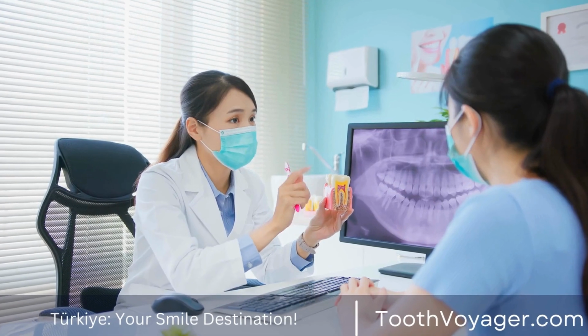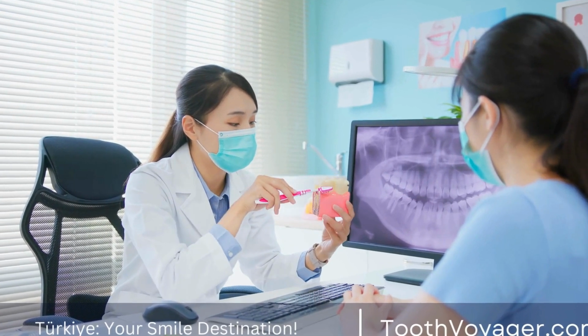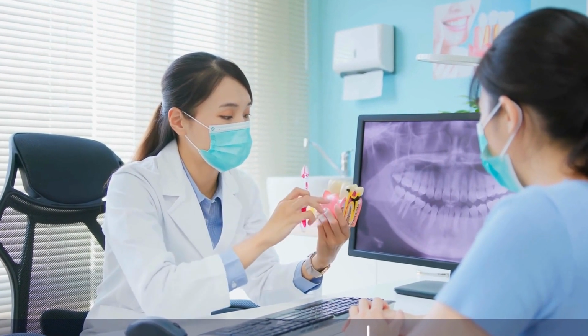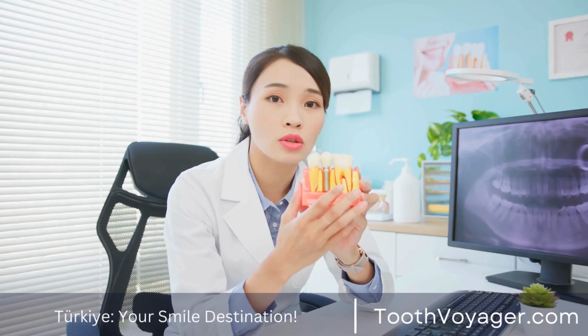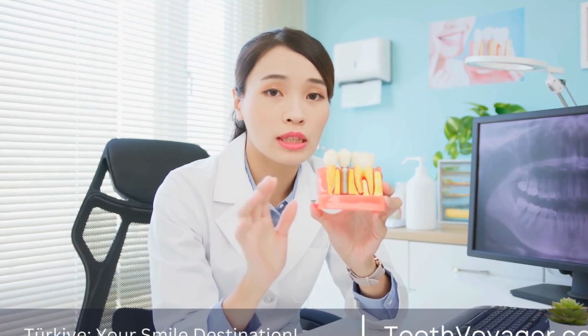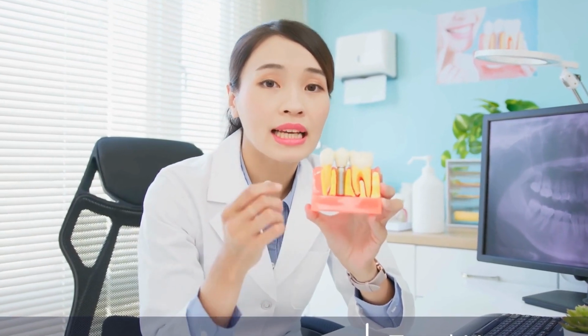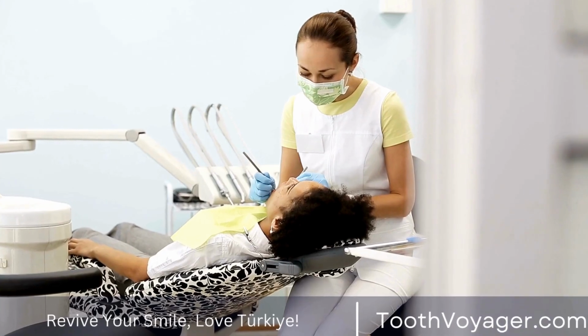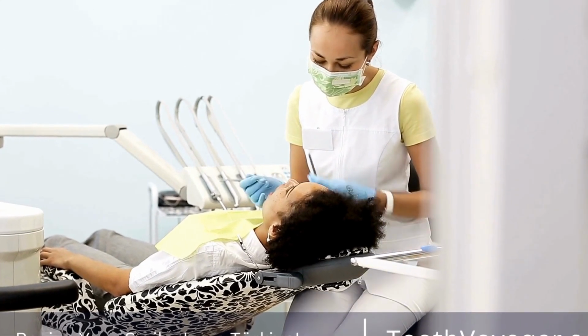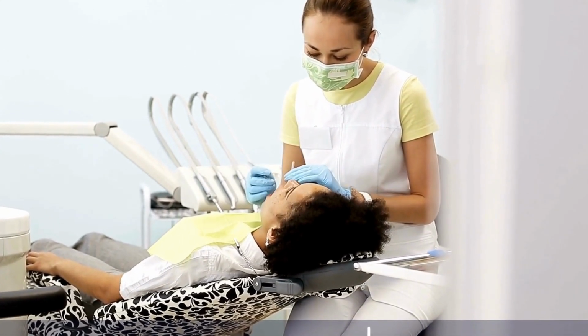It is vital to talk freely with the patient in order to make sure that the prosthetics that are chosen will meet their expectations and give them maximal ease of use. Following a consultation with the patient, the dental professional will collect impressions of the mouth to design a mold for the dentures. This process is vital as it lets the dental technician design custom prosthetics that will be comfy to wear and perform properly in the mouth of a patient.